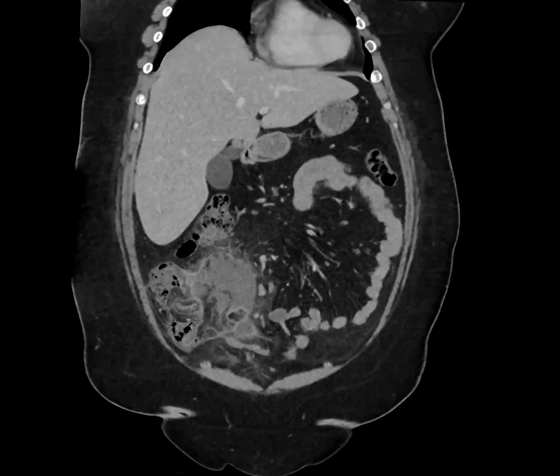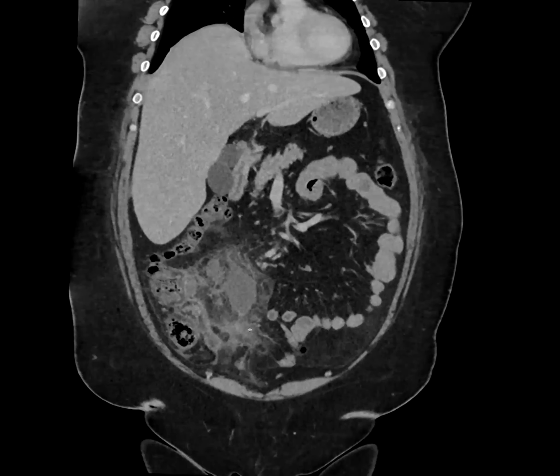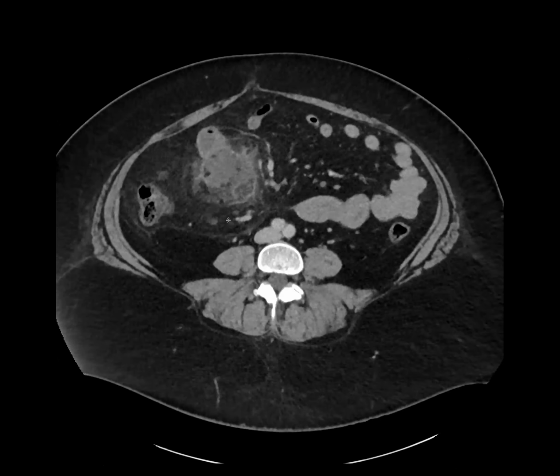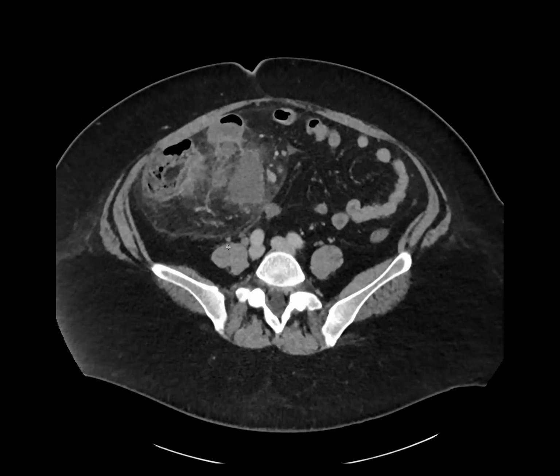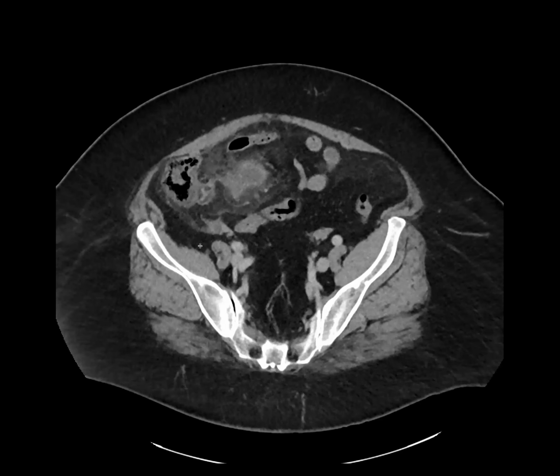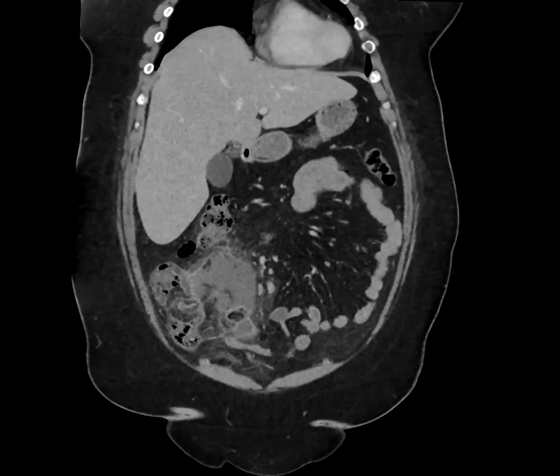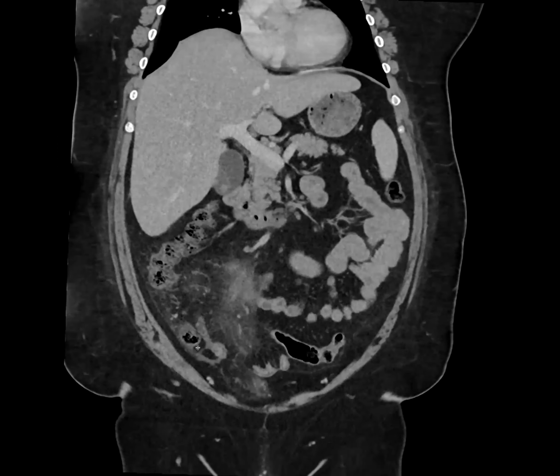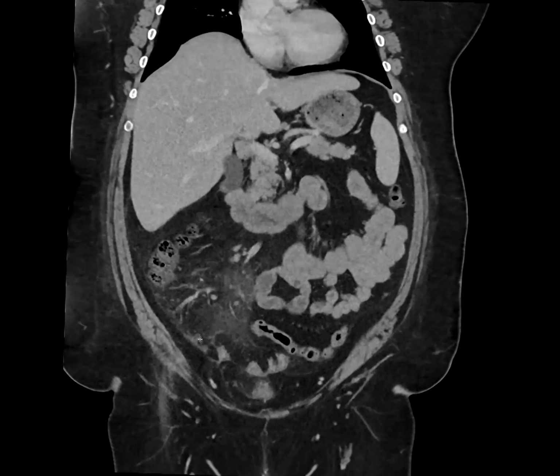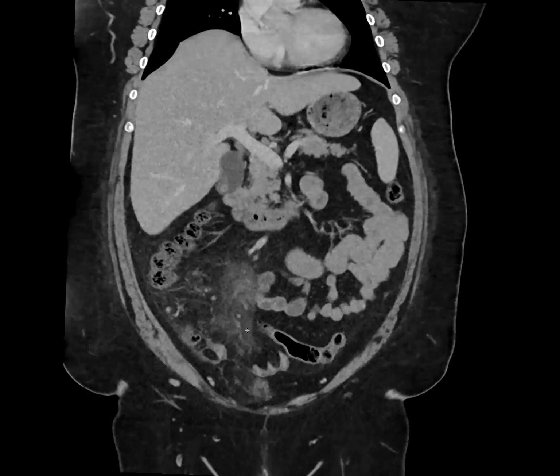So here are those lymph nodes. Are they reactive or is it malignancy? And the TI is right here. There's the ileocecal valve, and another stretch of ileum that's really thick. And was there a tubular thing like a Meckel's? Yeah, I was wondering if it's Meckel's. Where's the appendix? Okay, here's the ovaries. Let me see. So we said ileocecal valve and appendix. Is it maybe this? I don't know. Maybe this little thing. Could it be this little thing right there? Okay, scroll through the bowel loops again.